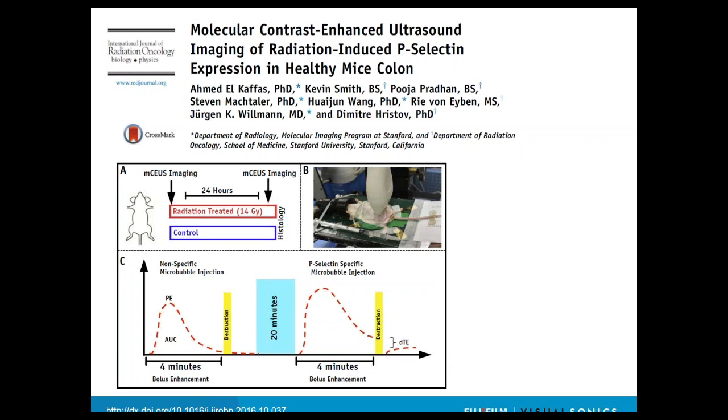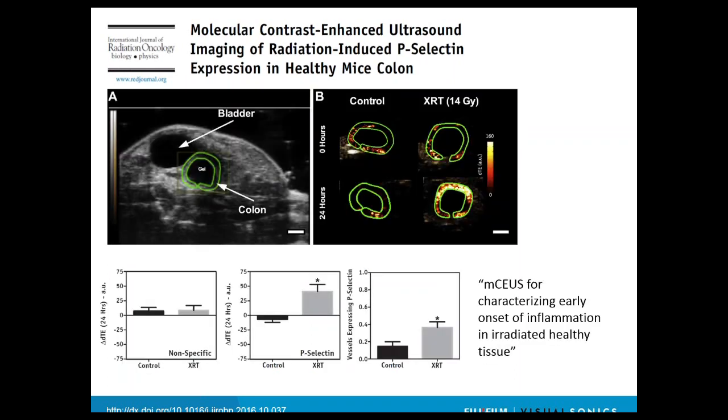And then they irradiated half of the animals or the treatment group and repeated imaging after 24 hours. And as you can see here, these are the pictures.